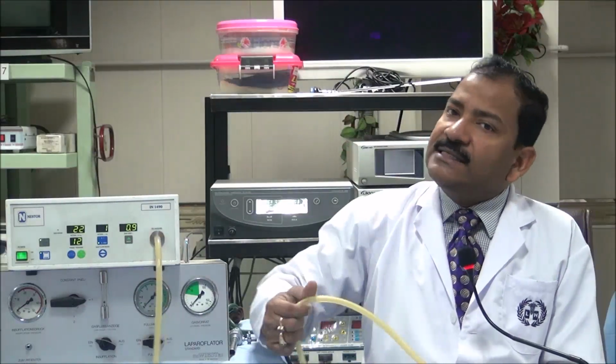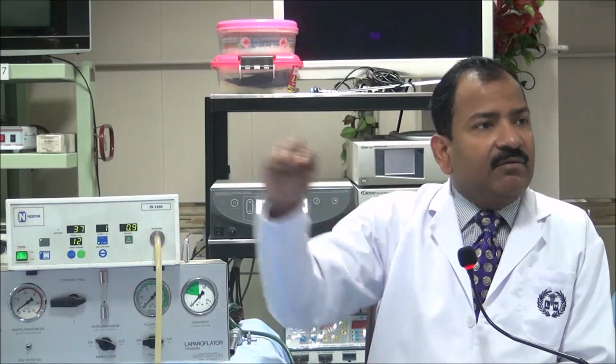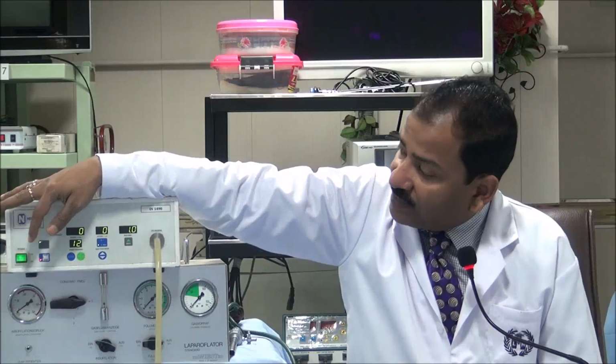Or the nurse is resting over the abdomen. Then also it can happen. And in those situations, wherever the actual pressure rises beyond the preset pressure, you should immediately understand that there is some block somewhere. Otherwise, even if you put it in the axilla or the thigh, it will not go above the preset pressure. If any chamber is available, it will not go above the preset pressure.